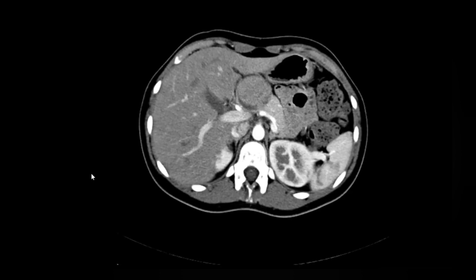After the descriptions, if you say summary, you will get the diagnosis and you will speed up and finish your case. As it is non-enhancing, I would like to keep it in the diagnosis of pancreatic adenocarcinoma, sir. How do you know it is not enhancing? Sir, I would like to see delayed images also in the pancreatic protocol, which we used to do.